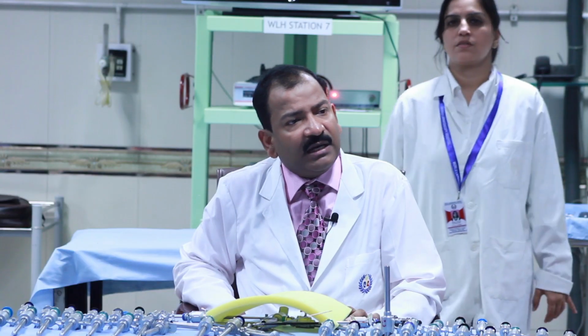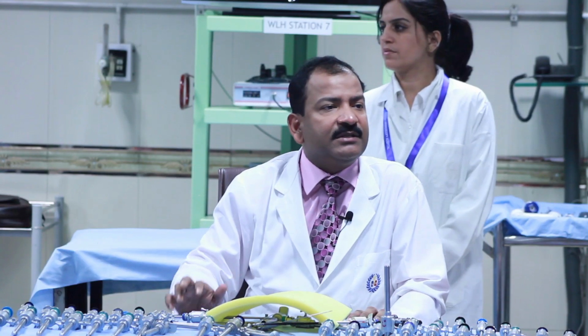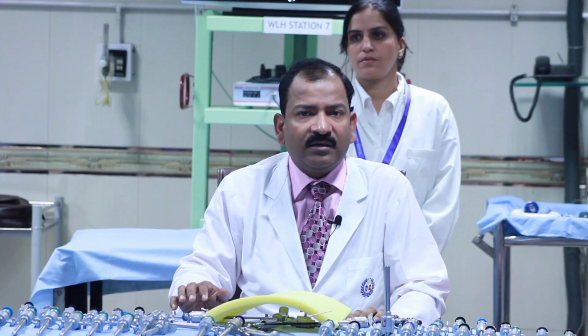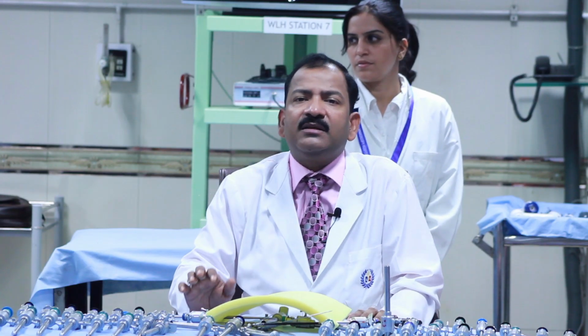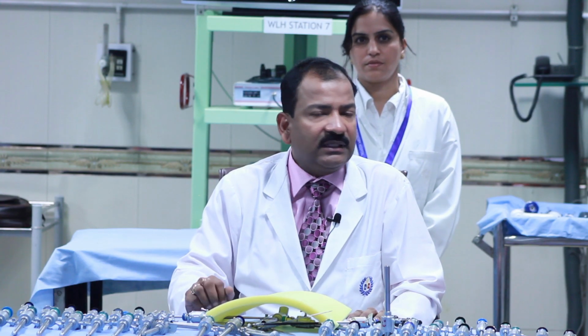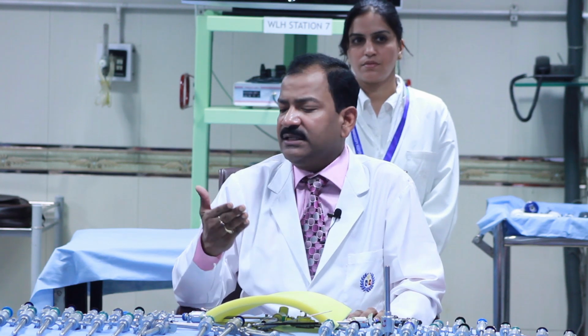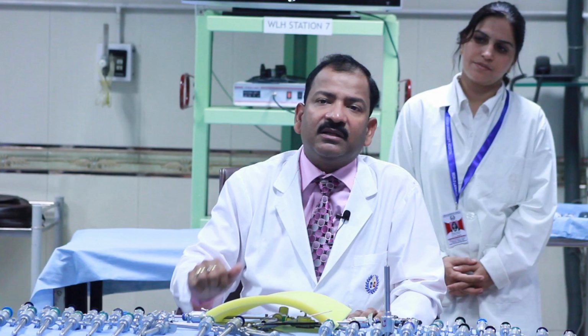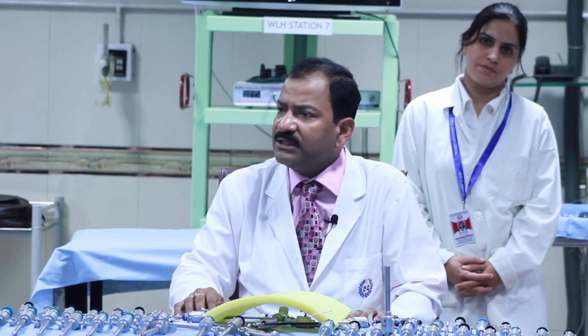It is good, but it is only good for a 6 to 8 centimeter uterus. That is a standard they have written. But in none of the books have they described these principles. They write and we remember 3 centimeter medial, 3 centimeter lateral, and then we apply it. But once the pathology size changes, we are in trouble and we always make a wrong port position.